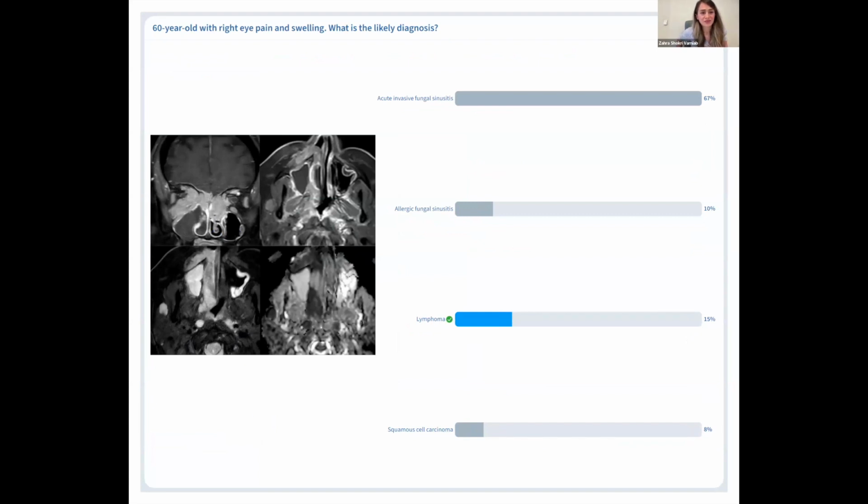Great question. So black turbinate sign is a sign of an acute invasive fungal sinusitis where you see a turbinate not enhanced. And in this case, the only image that I reliably show the turbinates are on this image. On the left, we see the inferior turbinate here that is enhancing. I do not see the right turbinate, and that's because it was resected. This is not a non-enhancing turbinate. This is secretions within the right nasal cavity, so the appearance is slightly different from a non-enhancing turbinate. This is just fluid clogging up the right nasal cavity.